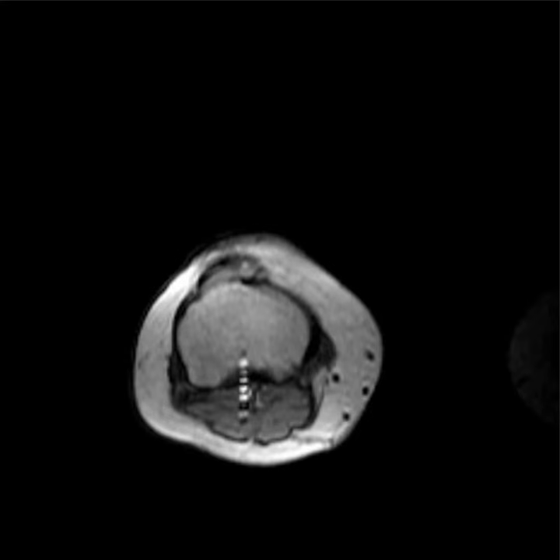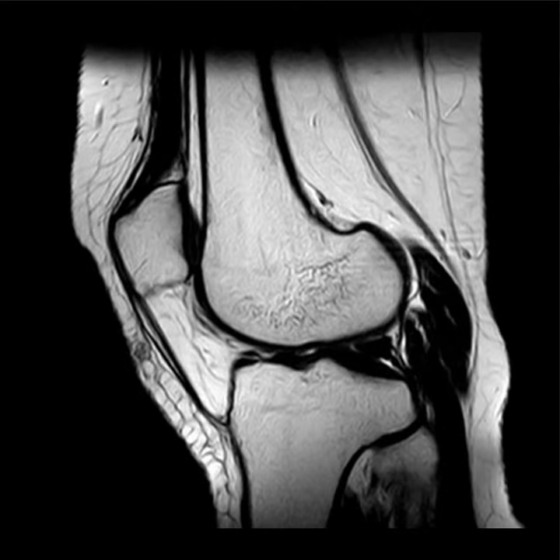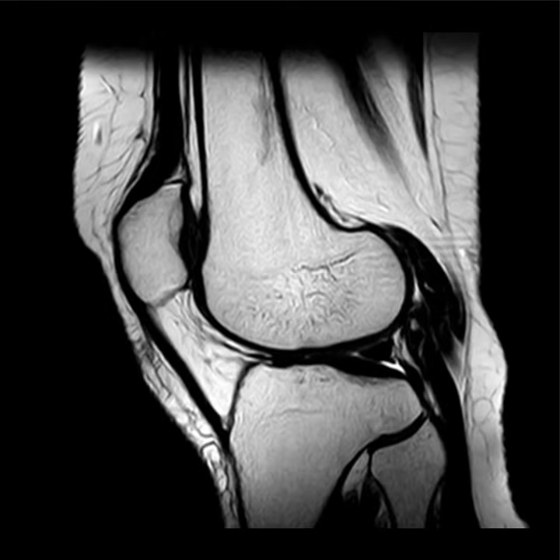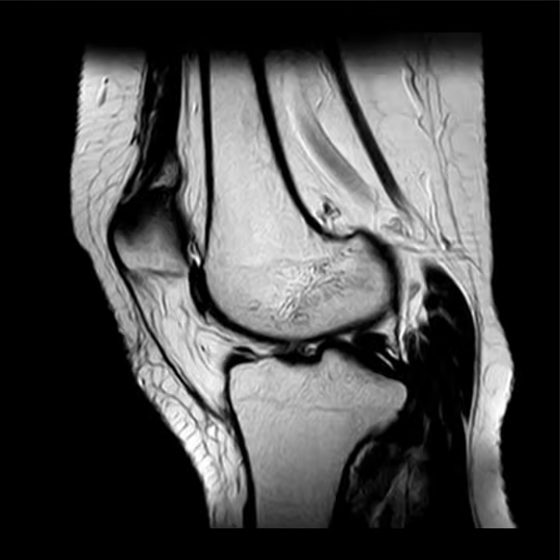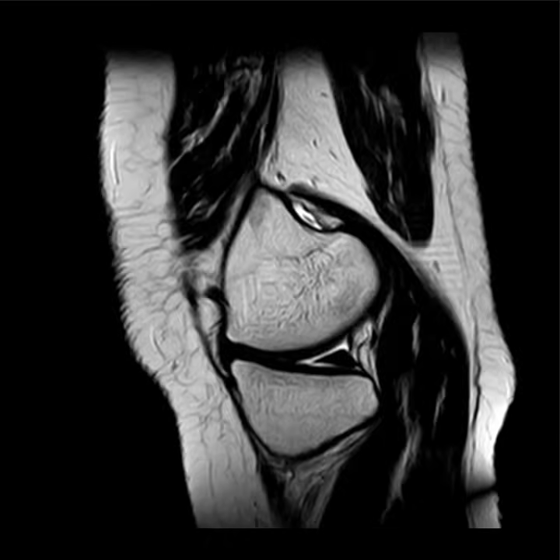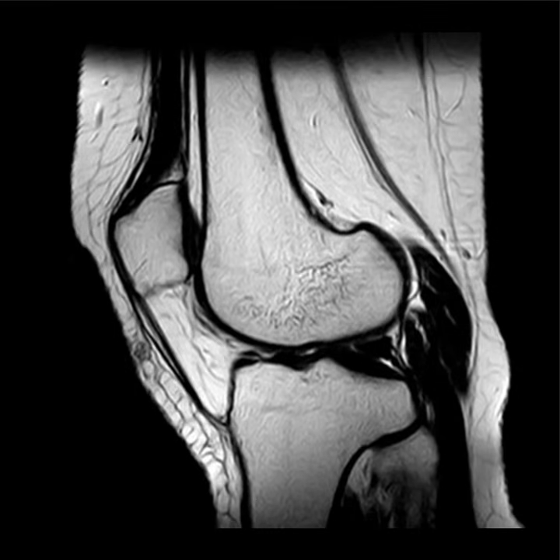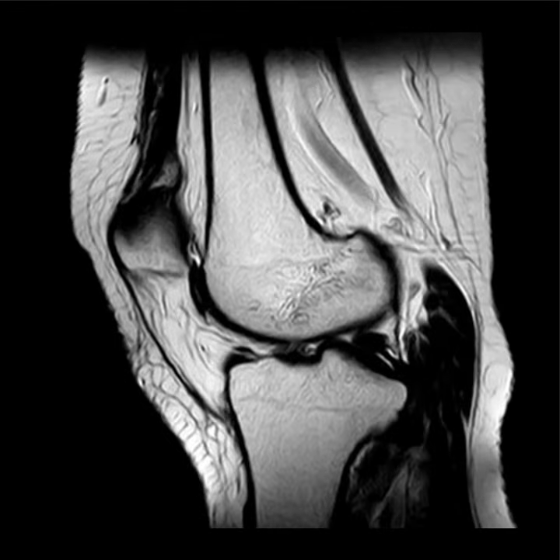Yes, sure, sir. First, let's see some T2 sagittal images. So these are sagittal T2 weighted images of the knee of this patient, and by scrolling, I can see there's nothing really significant here. Probably we can go to the T2 weighted fat saturated images for more information.